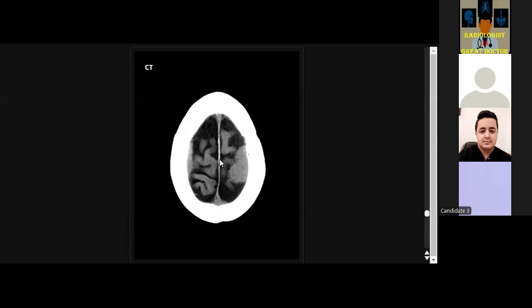This patient had a history of breast carcinoma, so I think this could be a metastasis from the breast carcinoma. Okay, other differentials for a dural lesion? I could think of maybe a nerve sheath tumor, but this is unlikely.